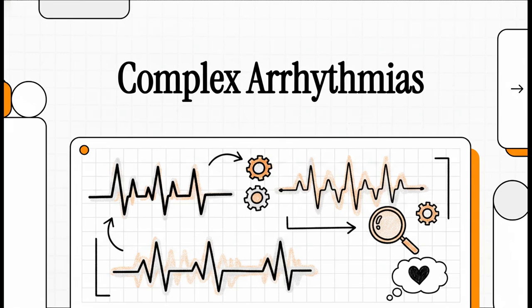Welcome. Today, we're going to deconstruct two ECGs that at first glance might look incredibly complex, maybe even impenetrable. But what we're going to demonstrate is how a rigorous, step-by-step, logical approach can transform what seems like a confusing tracing into a very precise diagnosis, one that really matters for the patient.